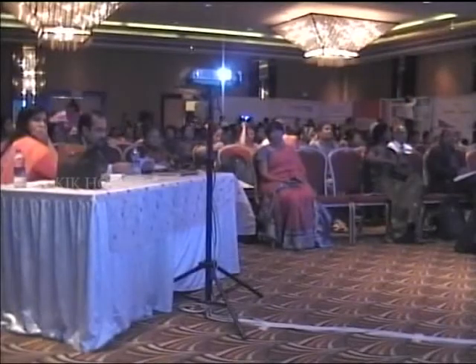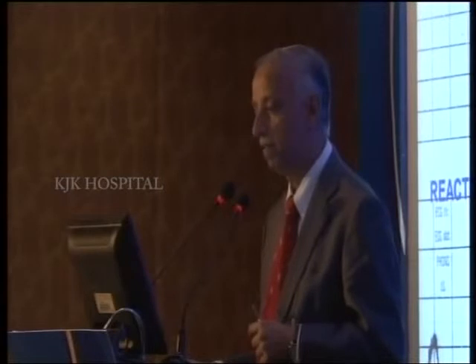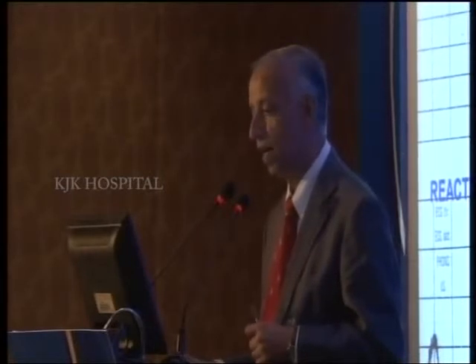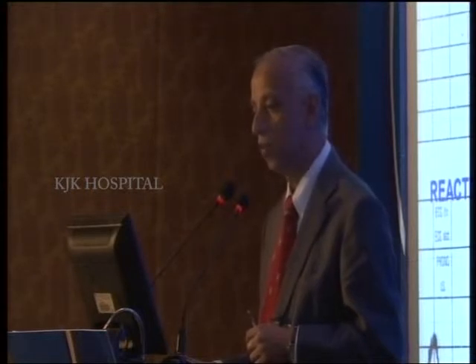So cardiac is actually the heart rate which is recorded on the paper, and toco is the contraction which is recorded on the lower half. And when we talk about the heart rate, we talk about the baseline rate, which is calculated by ignoring all the accelerations and drawing a straight line and reading it off a scale. And baseline variability is the wriggliness you see here.